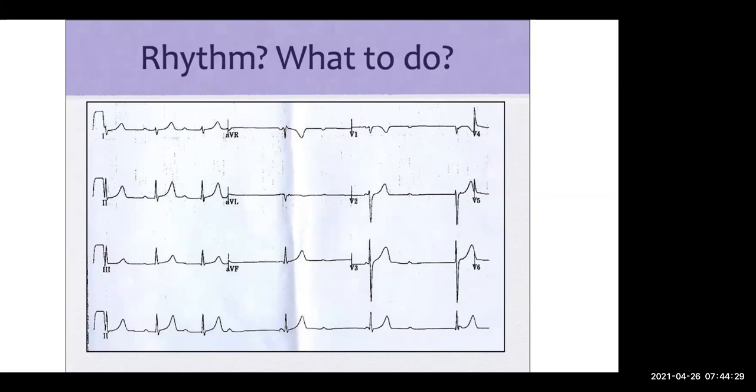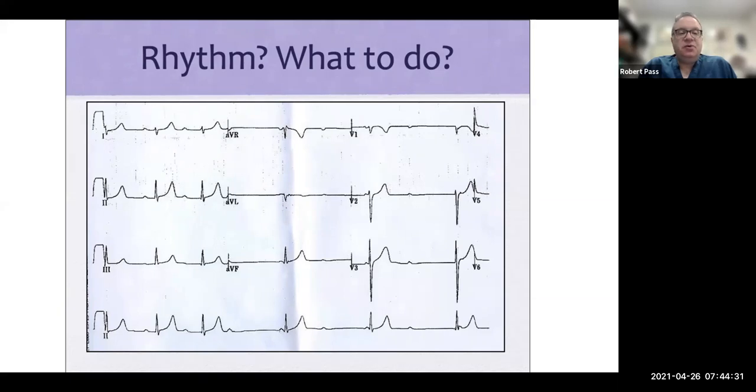I've had a handful of patients, maybe 3 or 4, who had some prolongation in their PR interval following ablations near their AV node that were not observed in the cath lab. One time I had a patient who had perfectly normal conduction during a slow pathway modification, never had a blocked P wave, completely normal throughout the procedure, was observed overnight, had normal conduction, had a normal ECG, came back the following week and had an ECG tracing like this, a full week after ablation.